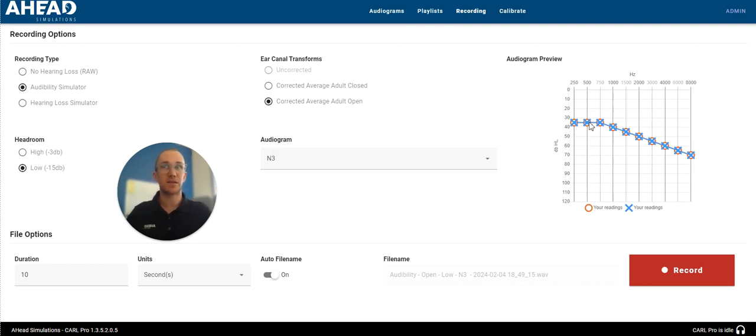All it does is it looks at all of these thresholds on the left and the right ear, and it makes a decision based on if the sound inside of this environment and inside of this recording is either in the limits of hearing for this hearing loss or is outside the limits of hearing for this hearing loss. And so if there was, for example, a bunch of sounds at 2000 hertz around 20 dBHL, it's going to get filtered out.